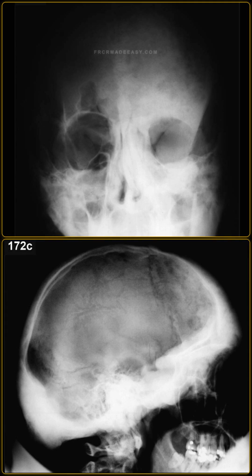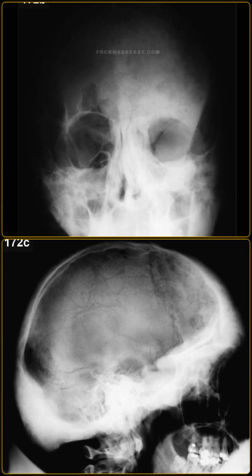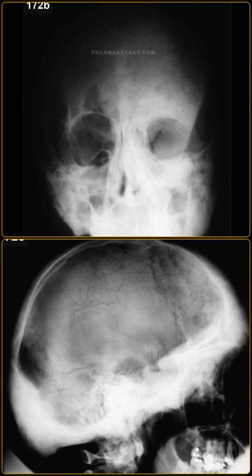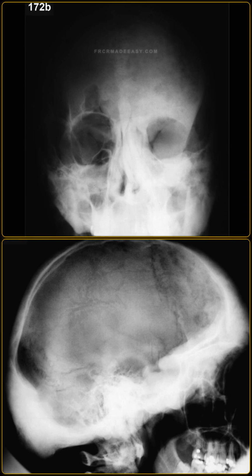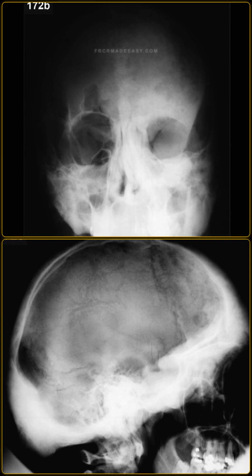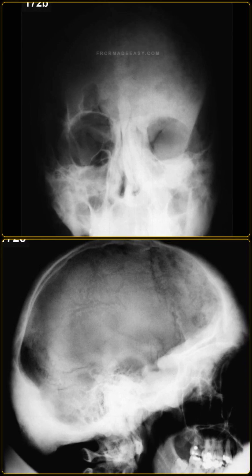The marked osseous overgrowth can narrow the skull base neural foramina, causing exophthalmos, visual impairment, and cranial nerve palsies. When polyostotic fibrous dysplasia occurs unilaterally and is associated with cafe au lait skin spots and precocious puberty in young girls, it is diagnostic of McCune-Albright syndrome.